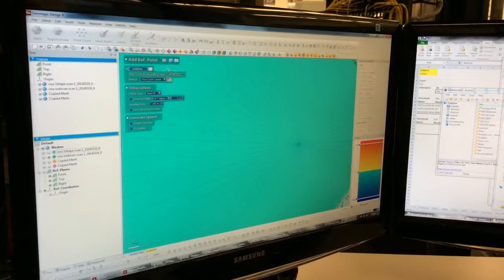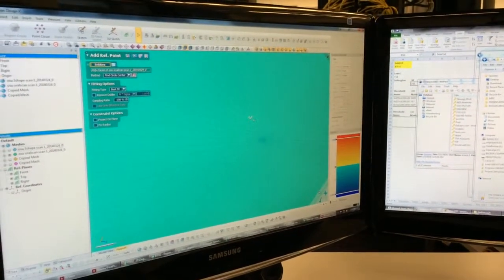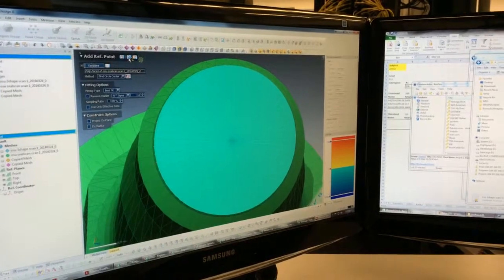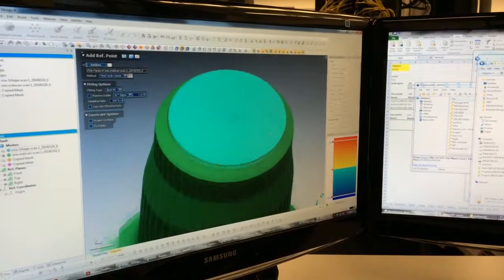Why would that be? Why is that pink dot there? What was the pink dot that came in? Did you see that? There are like two. Yeah, that's a good question. I don't know why the pink dot's there.